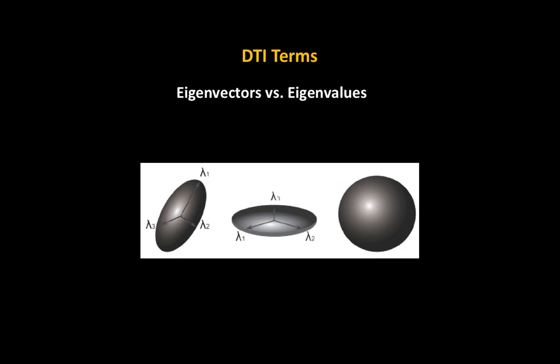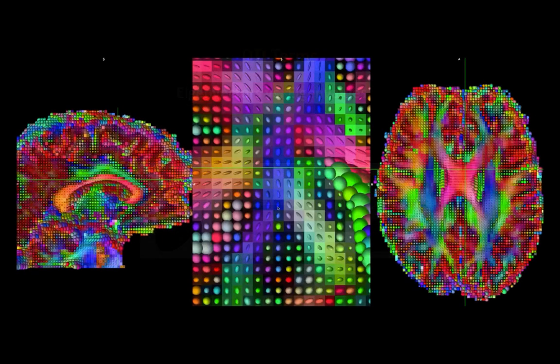Because if you can do that, you get finer maps that actually trace out what the directions are of these different white matter pathways. Now, where we left off before was we looked at these tensors that were fitted. So that model I was just showing you, this is what it looks like in the brain. This is zoomed in on a particular tract. And the color coding scheme is the same for both TBSS and for MRtrix, as I'll show you in a little bit. It's red going from left to right, it's blue going from top to bottom, and it's green going from back to front.